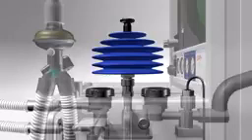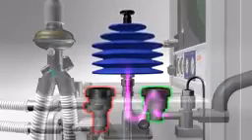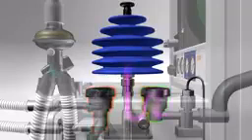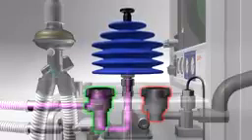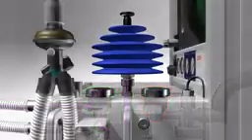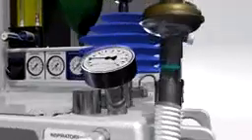When the bellows are raised, gas flows through the first non-return valve into the bellows. The second non-return valve remains closed. As the bellows are pushed down, the gas flows out through the second non-return valve into the inspiratory limb. The first non-return valve is closed. Another pressure relief valve ensures that excessive manual force on the bellows cannot cause harm to the patient.